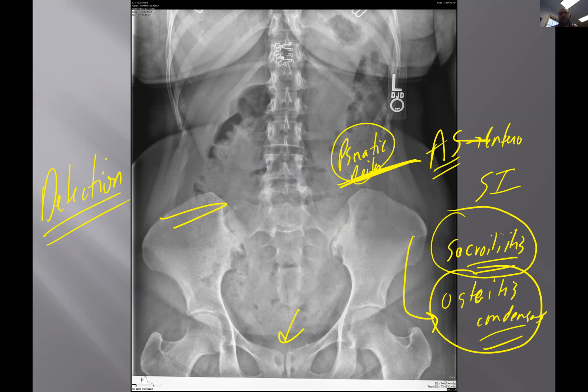That's a great question. The upper and middle bear the most weight, but watch this, and that's why you're seeing the sclerosis pop from the middle portion of that joint. On the other hand, the lower 1/3 or half is more of a true joint.